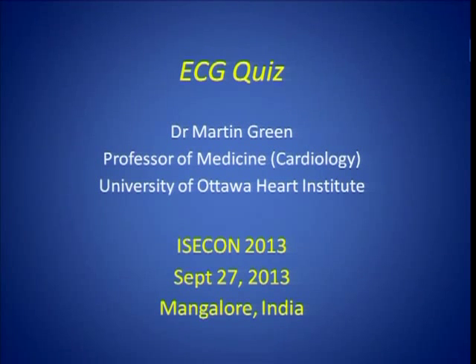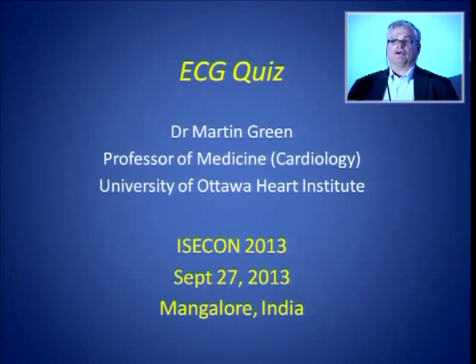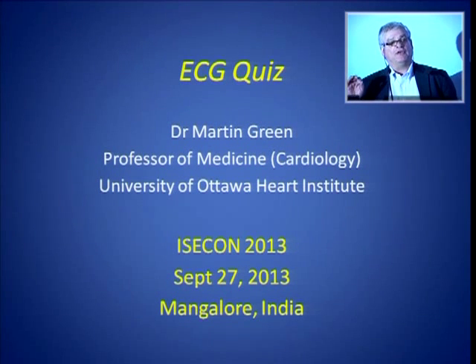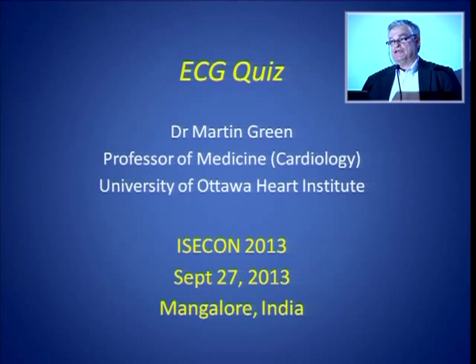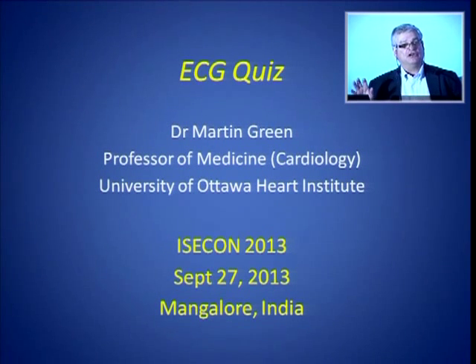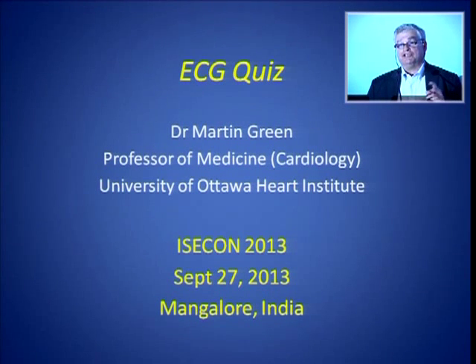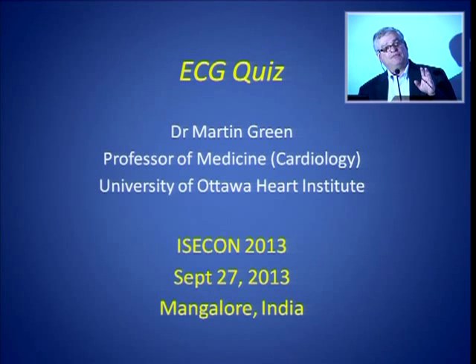What I intend to do is to start with the most difficult rhythm ECGs you're ever going to see. What I want to accomplish is to show you that by taking a simple method of looking at ECGs, we can make complex rhythm analysis easy. It's never really easy, but I'm taking a little bit of a chance here because I'm starting off with extremely difficult ECGs, and I think that extremely difficult ECGs get people very afraid.